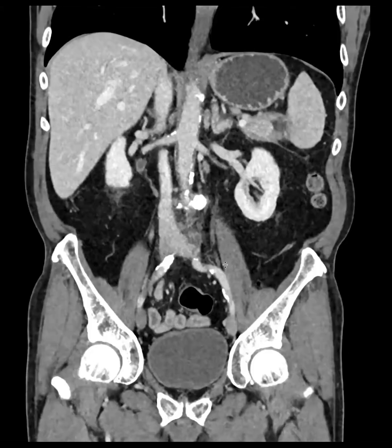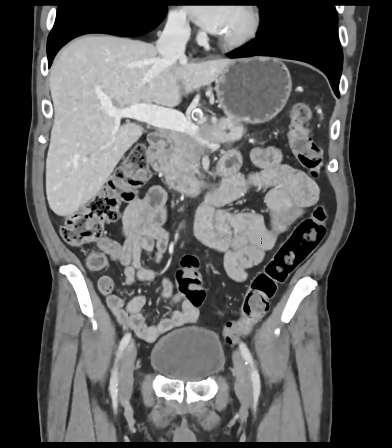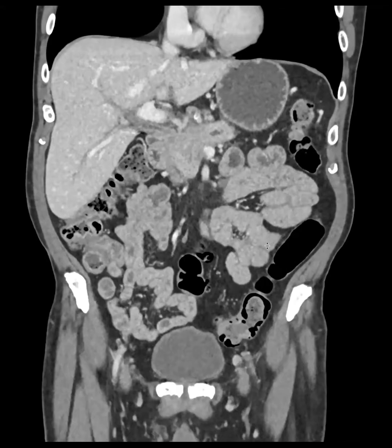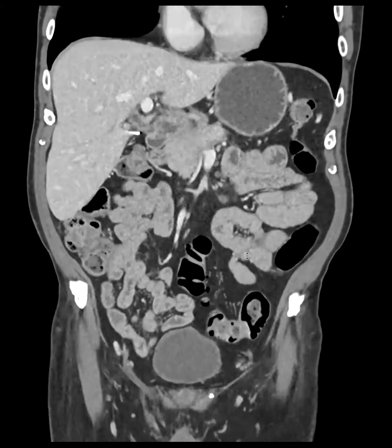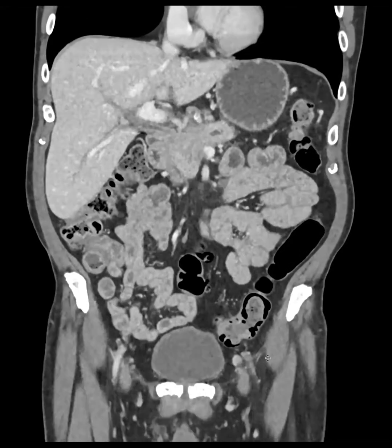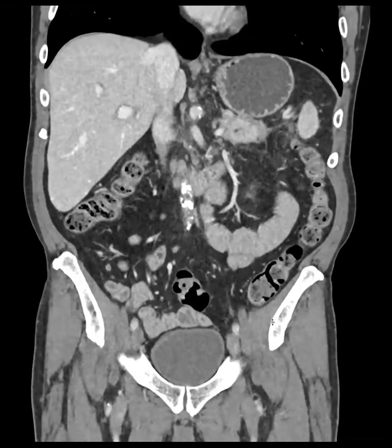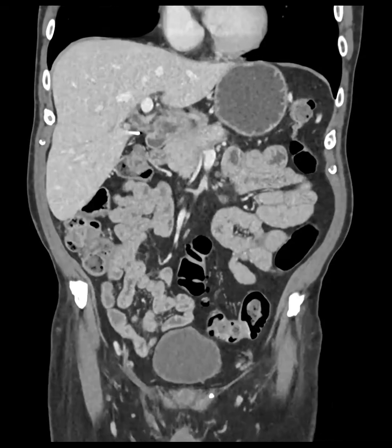And then you can get extrapancreatic manifestations as well. Yes, and actually I see it along the bile duct. Yes, do you see the entire bile duct is thickened? Yeah, perfect. So this was biopsied, proven IgG4. The patient got treated and did really well.